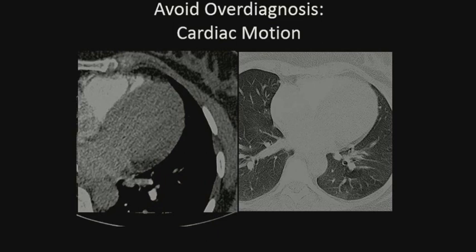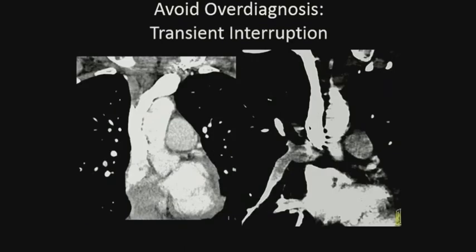However, as is standard in my hospital, the fetal maternal medicine service reviewed the patient and the CT with a subspecialty radiologist the following day. Their clinical suspicion was that pulmonary embolism was unlikely, and this was supported by the finding that the apparent PE was close to the left ventricle, and there was a double density along the margin of the left ventricle. So it was concluded that, in consensus, she probably did not have a pulmonary embolism on the contralateral side of her pain, and she was discharged on prophylactic low molecular weight heparin until 6 weeks after delivery, and had no thromboembolic episodes on follow-up.